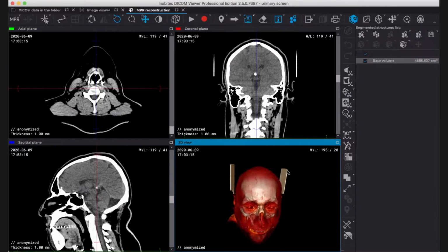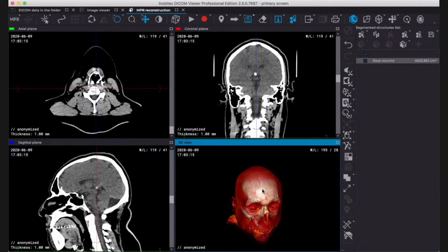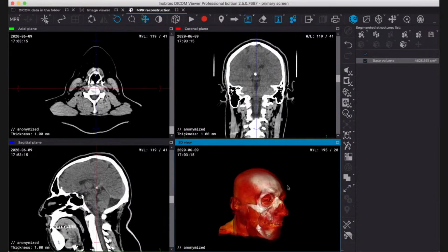And there's one easy thing we can do. We will not use the table for anything. So there's this icon here, which is table removal. You just click over it, and the software will automatically remove the table, which is nice.